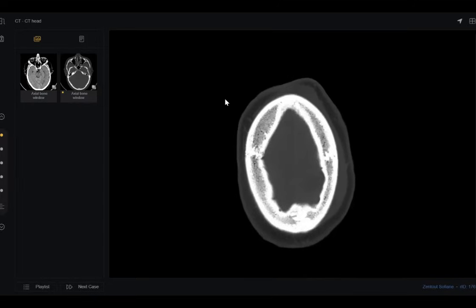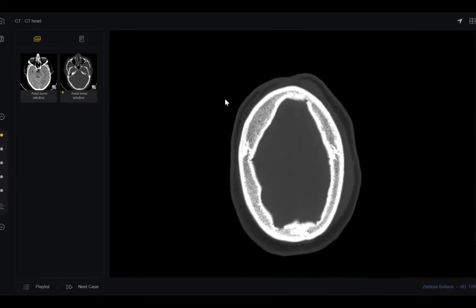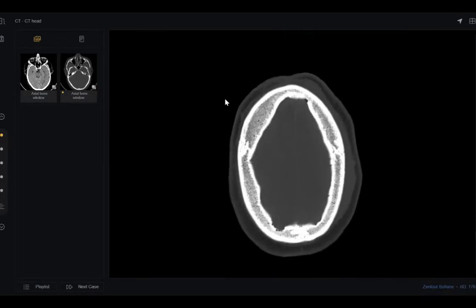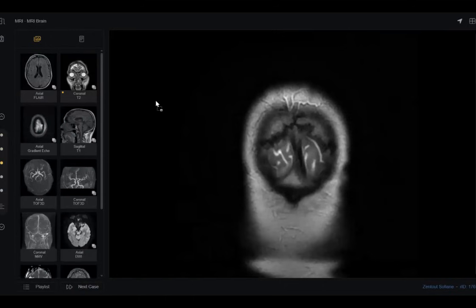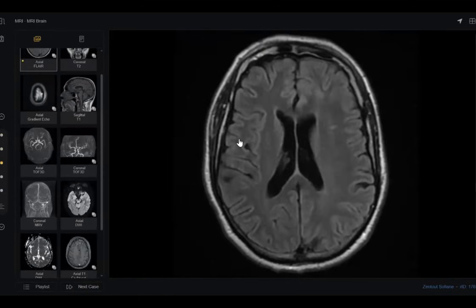So what happened? In the bone window, I can see that there is some cortical thinning in the same location. Okay, what else? Also there is like a soft tissue component on the left frontal bone. You get some benefit when you ask for bone window.